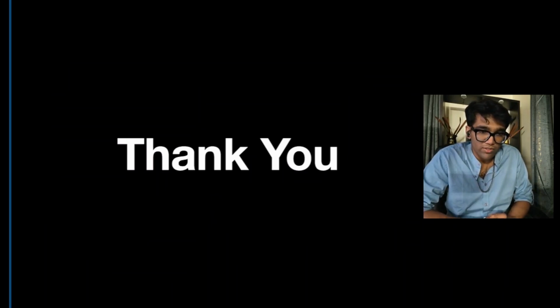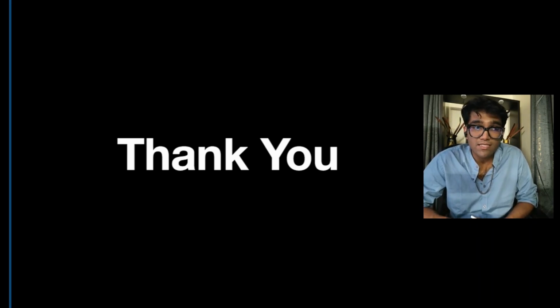Okay, so that brings us to the end of our talk on the assessment of LV systolic function. However, this is not intended to be a very rigorous discussion on all of the methods to assess systolic function, although I've covered most of them. What I want you to understand is how it is interpreted.